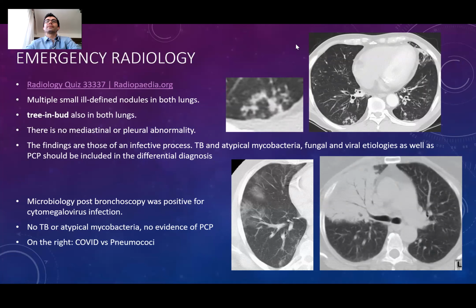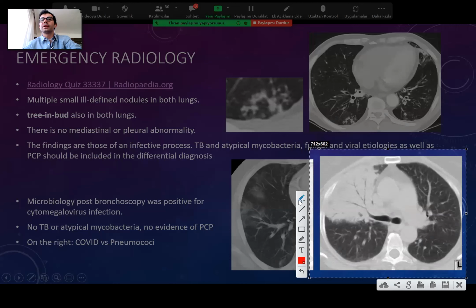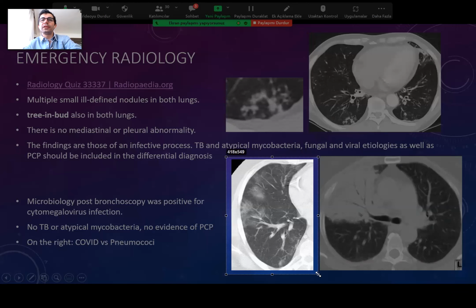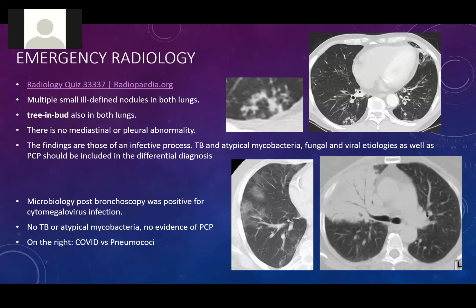Usually community acquired pneumonias look like this: they involve only one segment or lobe of the lung, which we call lobar pneumonia. I am sure you have heard about this before. Sometimes there are also patchy infiltrations in ground glass densities, like hazy, cloudy appearances. Does this look familiar to anybody? Do you remember something when you see this? COVID. Yeah, right. Typical COVID. It looks really like it, with hazy areas on the periphery of the lungs, right?